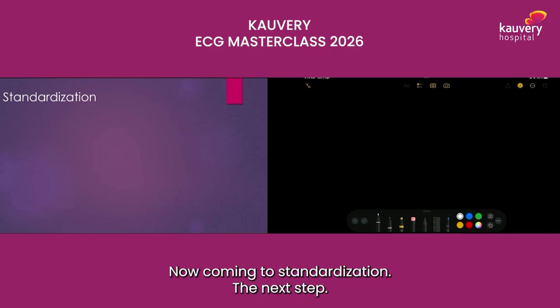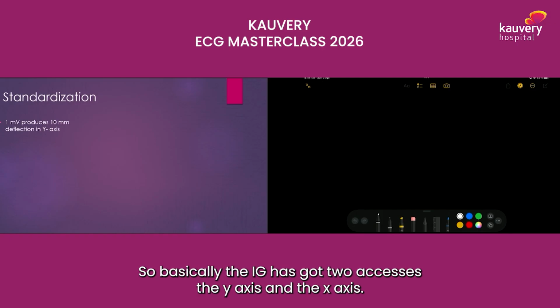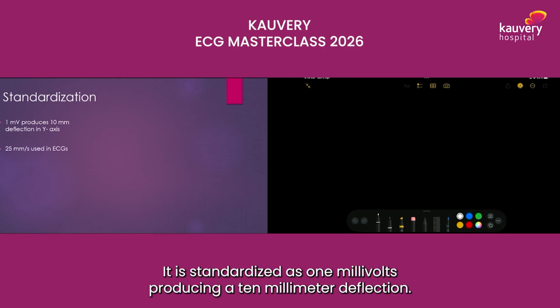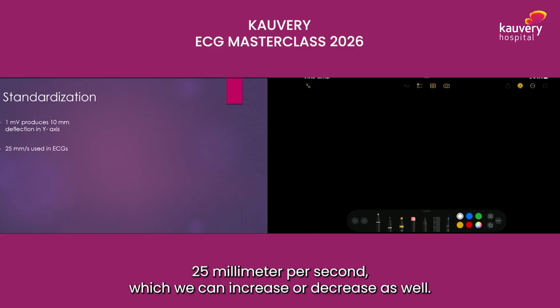Now coming to standardization, the next step. This is often an overlooked aspect. We just go and start reading the ECG. But one thing you should identify is whether it is standardized properly or not. The ECG has two axes, the y-axis and the x-axis. The y-axis measures the voltage, in millivolts, and in a standard 12 lead ECG it is standardized as 1 millivolt producing a 10 millimeter deflection, so 10 small squares. And the x-axis is the speed of the ECG, usually 25 millimeter per second, which we can increase or decrease as well.